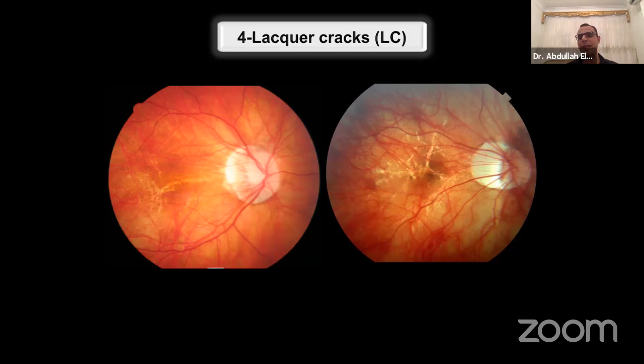And that's why my feeling is that dome-shaped macula will be a useful thing if further research is done on dome-shaped maculopathy, because in dome-shaped maculopathy, you see asymmetric scleral thinning. So why does the sclera thin asymmetrically? For example, if there is a posterior staphyloma, you expect a uniform thinning. But in these eyes, the sclera thins around the fovea much more than at the area of the fovea. It seems like the fovea is protected in one way or another by the dome-shaped change. But we hope something may show up in the future.